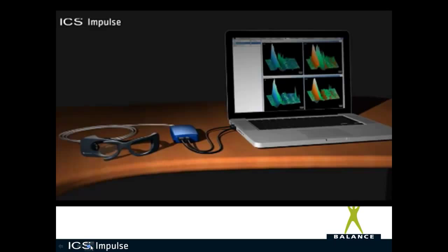Hi, today in this ICS Impulse video we will be talking about data analysis. Here you see the ICS Impulse device, a computer with the ICS goggles.